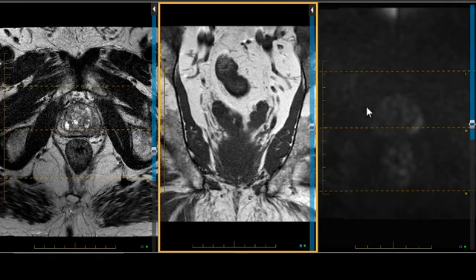Now let's turn our attention to the diffusion image, by the way, at 3 Tesla. And I'd like you to compare back and forth this 3 Tesla study with the 1.5 comp image that was a PI-RADS 4 or 5, like this one, to look at the disparity in image quality, of which there really isn't any. And here is your axial diffusion image at a higher B value.